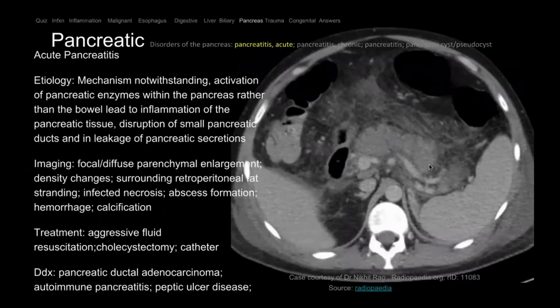Okay, pancreas, 950. So pancreas, here is a CT abdomen pelvis, spleen. This is the liver. This is the pancreas. This is the duodenum. And you see there's all of this inflammation around the pancreas. The normal fat intercalated into the pancreas is obliterated.